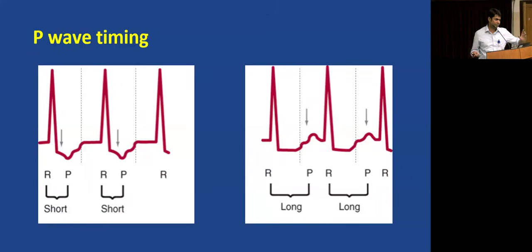Okay. Now, what are the examples of this long RP tachycardia? The most common example: this P wave is directly going, so it's just tachycardia and it's going to QRS with a normal PR interval. Sinus tachycardia, right? So it's not an SVT, but if something is going on like this, you always suspect it's a sinus tachycardia. You look at P wave morphology. Now, most SVT presents with what you call a short RP tachycardia. The short RP tachycardia means this P wave is somehow related to this QRS. If that is the case, then what are your differential diagnoses?